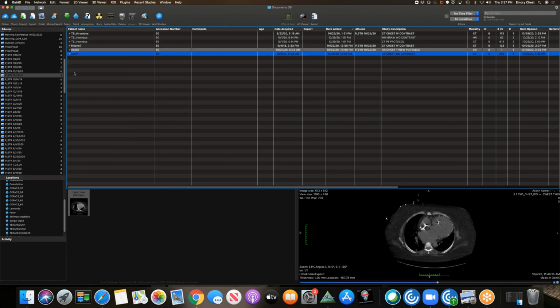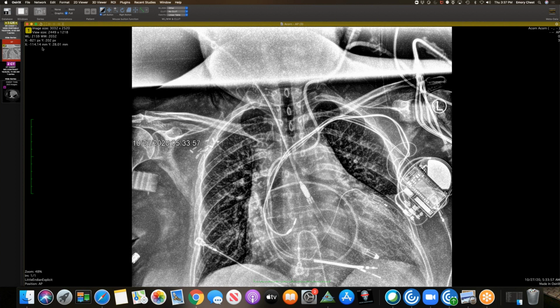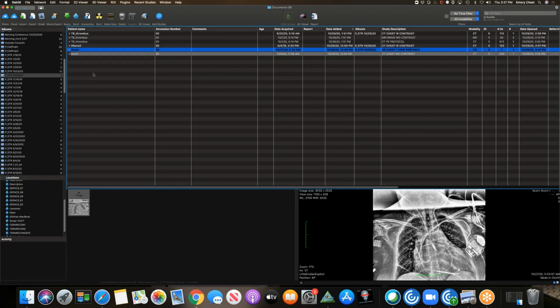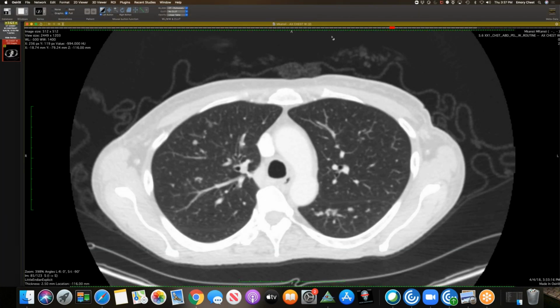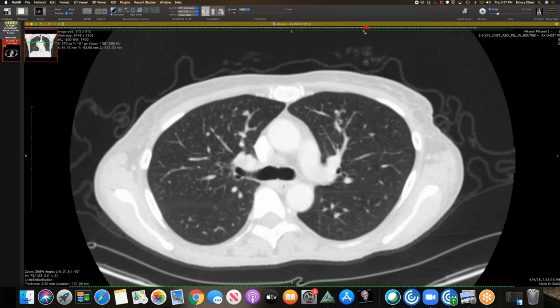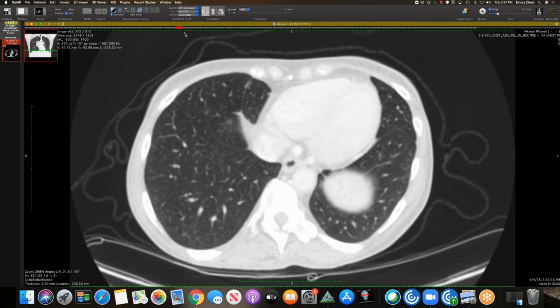Wow. And no lymphadenopathy to speak of. I guess maybe a little right internal mammary node there, which probably has silicone in it too, but that's it. So that's my one interesting case for this week.